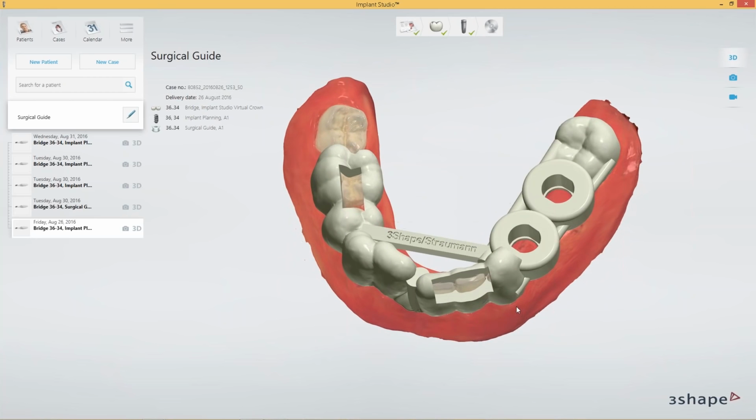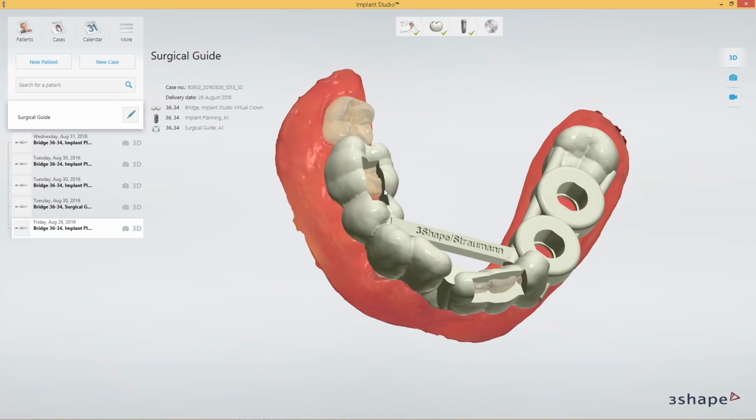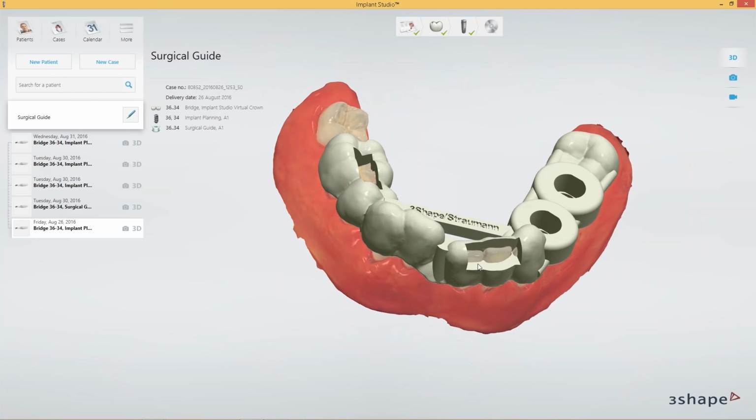So it's important. On the other side, again, a window to show that we are down firmly, not leaving any risk by having a problem with the fitting, because if it doesn't fit perfectly, the inclination or the angulation of the implants will of course be wrong. So this is a critical area to check when placing the guide before surgery.